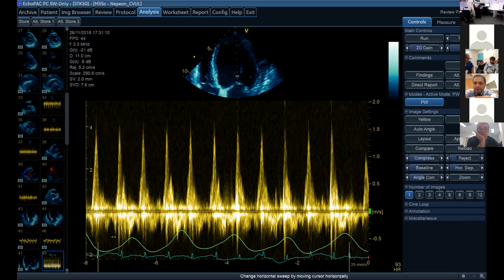But I use this as an example of how sometimes I find it really difficult. Sometimes patients don't read the textbook. Here you can see that we're not seeing those huge variations in flow. You see the respiratory flow pattern at the bottom. Sometimes you don't see that. I'd use this as an example to say that sometimes it's not as easy as it is in the textbooks.